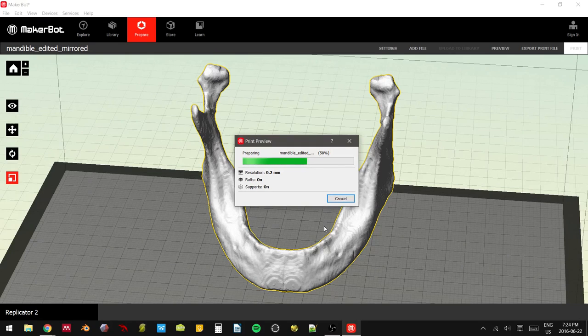NinjaFlex is so good. And the last one is just a vanilla 0.35 millimeter solid extrusion nozzle. All of them are the newest hot ends, so they can reach up to 290 degrees Celsius without triggering a kill command, or I guess hitting the maximal thermal temperature for the TAZs. And that's useful for things like high strength nylons and polycarbonate.